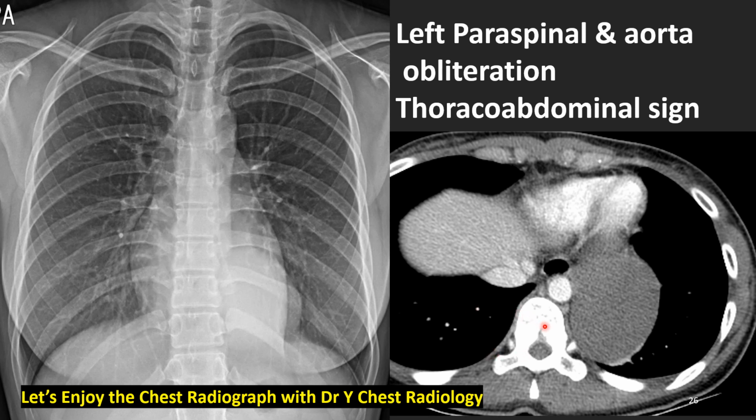On axial contrast enhanced CAT scan, we see the posterior paravertebral compartment tumor overlying with visceral compartment, homogeneous density, well-defined mass, with paraspinal stripe, aorta line obliteration. Posterior compartment, paravertebral compartment tumor, most likely neurogenic tumor.